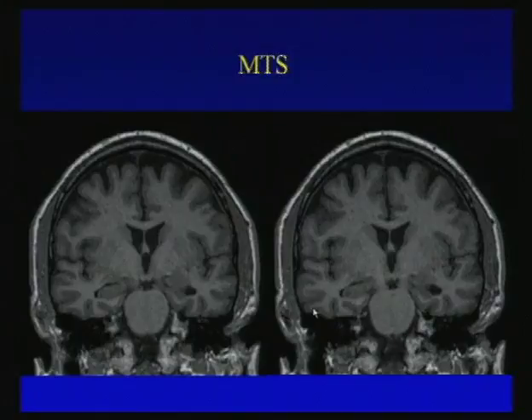Here's a patient who has temporal lobe seizures on EEG, and if we compare the hippocampus on the right to the left, we see that the left is severely atrophic. There's dilatation of the temporal horn. This patient's a little tilted. We see a piece of the amygdala.